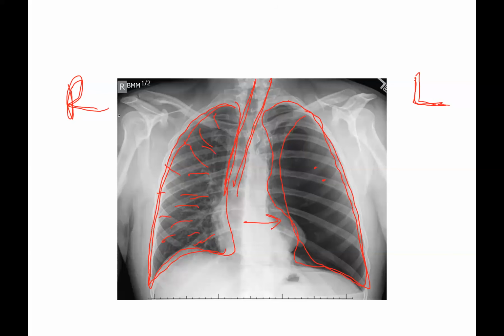Halima, what do you think is wrong with this patient? Sir, I think it's a tension pneumothorax. Why do you think it's a tension pneumothorax?